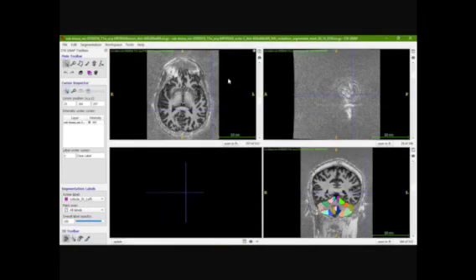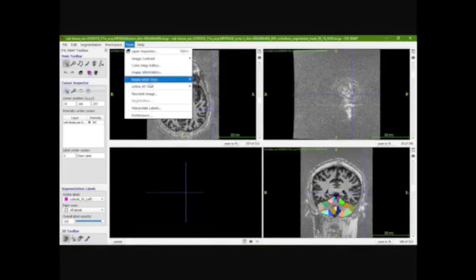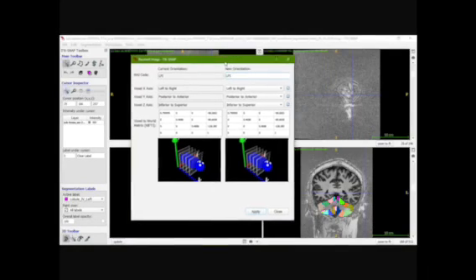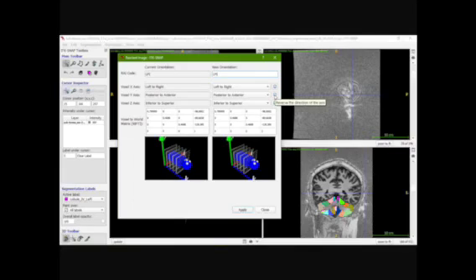So I'm going to close it, and the other feature that I want to show you is the reorientation of the image. In the development of this mask, I was using an atlas where the sagittal view of the cerebellum was not matching what was showing up on the screen that I was working on. So what you can do is click on reorient the image, and then click on posterior to anterior. You can play around with all of this. It's just to show you where you can see those options.